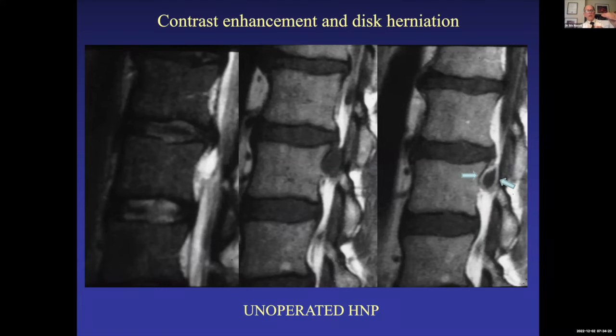So when we're doing post-contrast scans for post-op, we think, okay, well, the disc won't enhance and the scar will, if we're doing post-contrast MR. And CT, you see the same thing. However, an unoperated disc may enhance, particularly peripherally, because if the disc fragment has been sitting there for a while, it develops peripheral vascularization. So this unoperated disc fragment is enhancing peripherally because the body is trying to resorb the disc by inducing granulation at its margins. And over time, this disc may resorb.